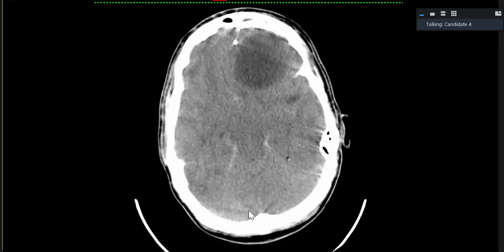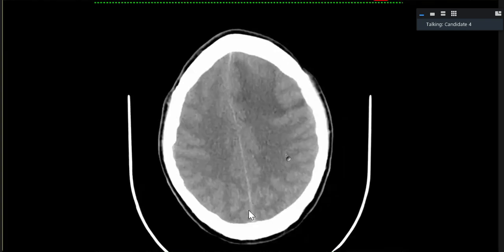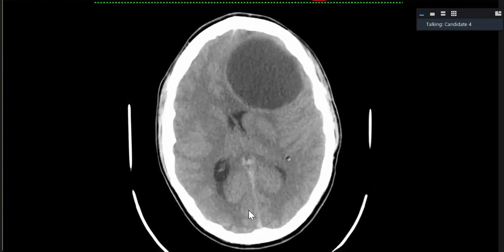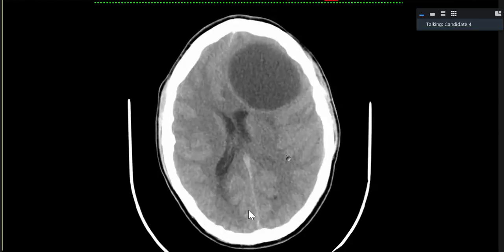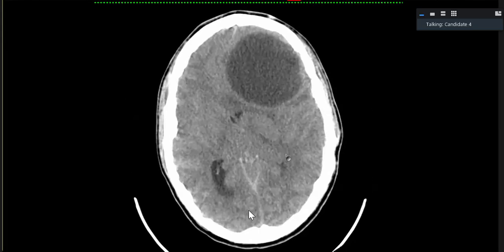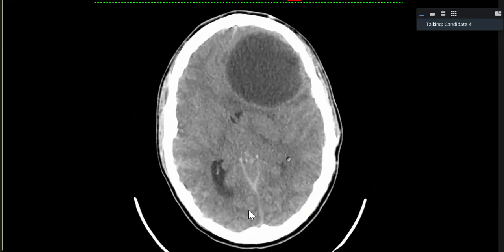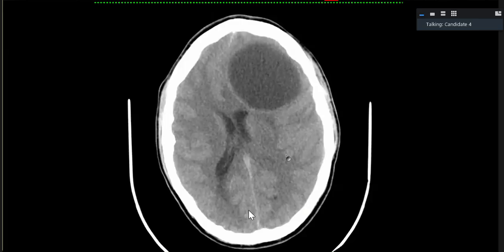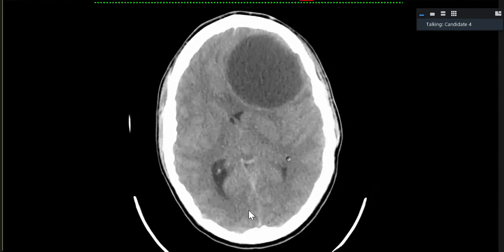Okay, I'm presented with the CT brain non-contrast images of an 18-year-old patient who presented through emergency with a history of fever. I can appreciate a well-defined intra-axial cystic lesion with some debris-type contents within the left frontal lobe. It is causing subfalcine herniation, and there is associated edema.